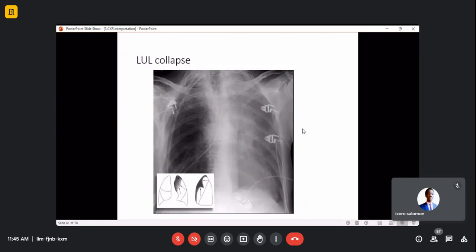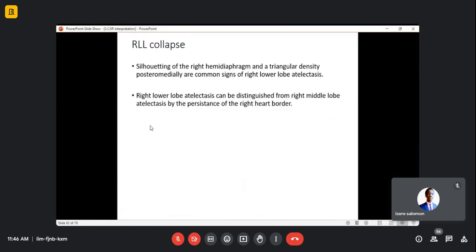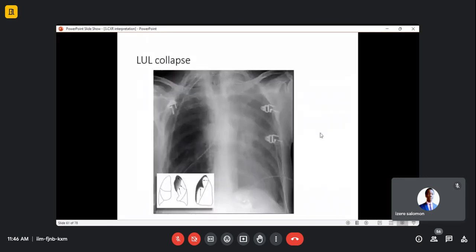Look, let me go schematically, just go to the opacity. If I check this, first of all, I know this patient is very sick, likely being in the ICU because of this material we can see on the chest. When I see this, immediately I say most likely the patient is in ICU, even before I'm told.